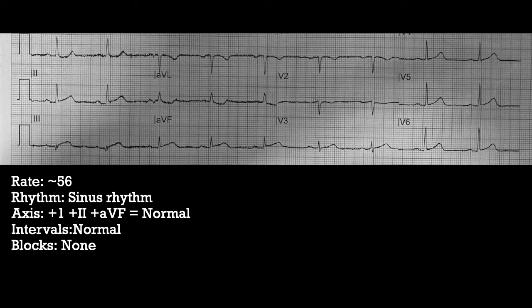And we see a similar looking thing in lead AVF. That ST segment looks like it is up. It's maybe a millimeter right at it, but these are pretty small QRS complexes too. So in comparison to the size of the QRS complex, that looks like that's probably pathologic. That one in particular right there, that looks like a STEMI to me. And we see that in 2 leads that follow a vascular distribution. So this is concerning for ST elevation and potential STEMI.